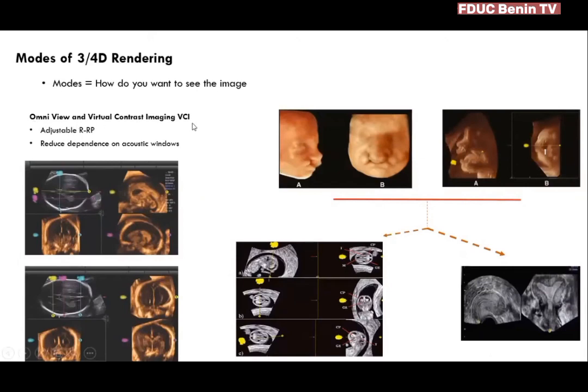We recall that in the previous slide I had mentioned that for us to have a successful 3D/4D acquisition, we need to satisfy certain criteria, which include a nice anatomy in profile, having the acoustic window, and placing the reference reconstruction plane in the acoustic window so that it renders the surface anatomy in front of that reference reconstruction plane.